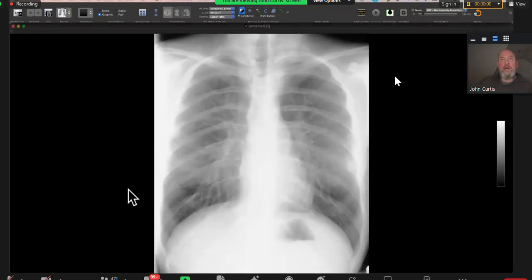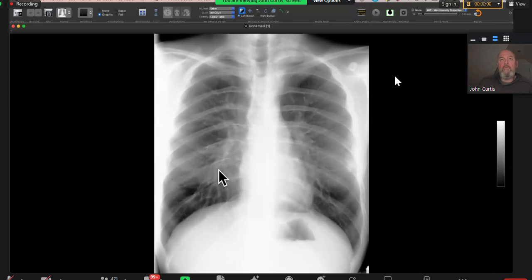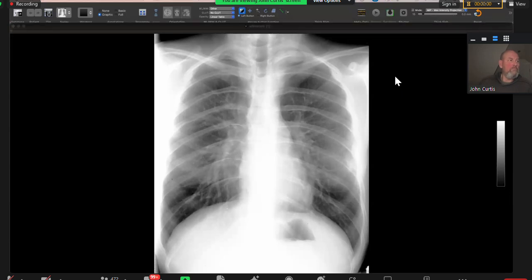Okay, this patient is suffering from high blood pressure. So I'm provided with the chest radiograph of a skeletally mature patient, in which I cannot appreciate the aortic knuckle properly, and there is bilateral inferior rib notching, starting from the third, fourth, fifth, sixth, seventh, and likely eighth ribs bilaterally.